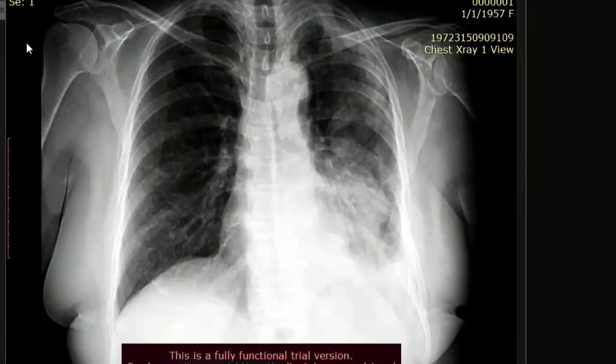So I am provided with the chest X-ray frontal projection of a female patient. I can appreciate that the right breast shadow and left breast shadow appear to be dense. Coming towards the lung fields, there is mild reduction in size of the left lung field, and there is homogeneous opacification of the left lower zone that is obscuring the left costophrenic angle as well as the cardiac silhouette, and it is extending around along the mediastinum.